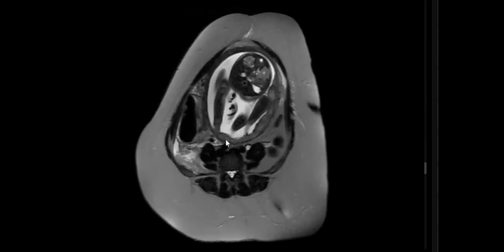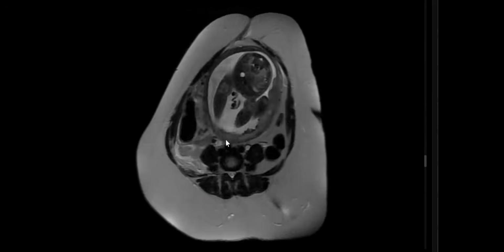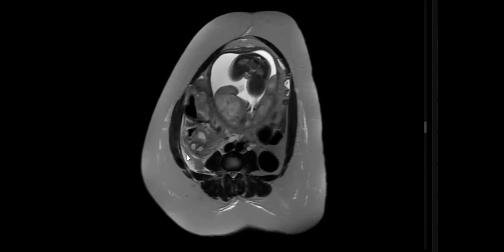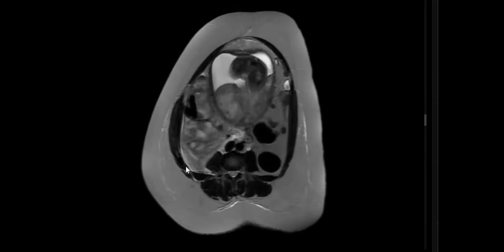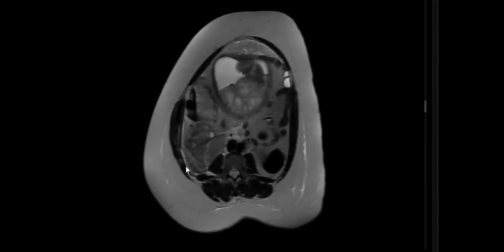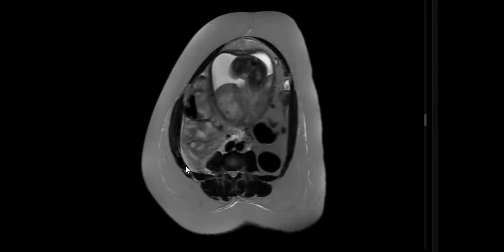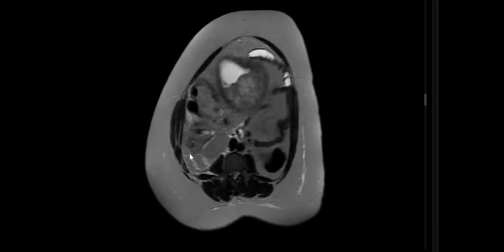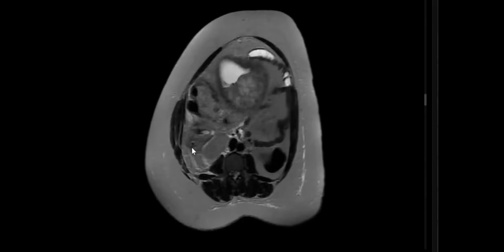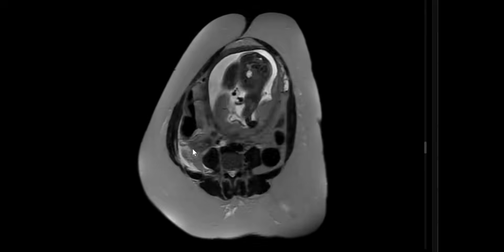Appendicitis in pregnancy usually occupies a higher location, not the usual location in the right iliac fossa. Here we have free fluid in these areas and some smudging fat planes. It guides us to the source of acute abdomen or infection, and we start below the liver downwards. You see the filling defect again? It's an appendicolith, obstructing. Very good, my friend.